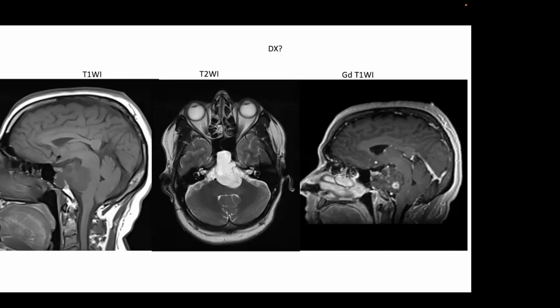They're locally invasive. They are a terrible disease to treat, and patients suffer. They have severe headaches associated with these and disability. But this is a typical appearance of a chordoma.